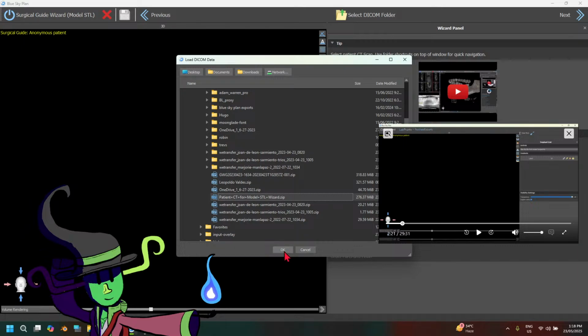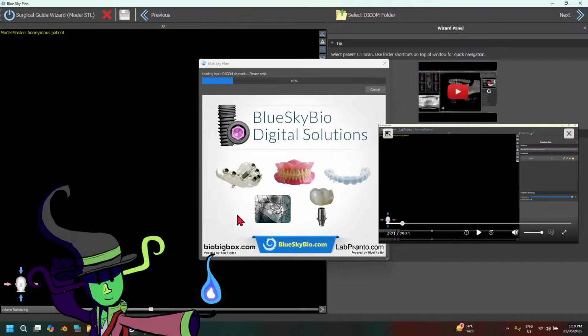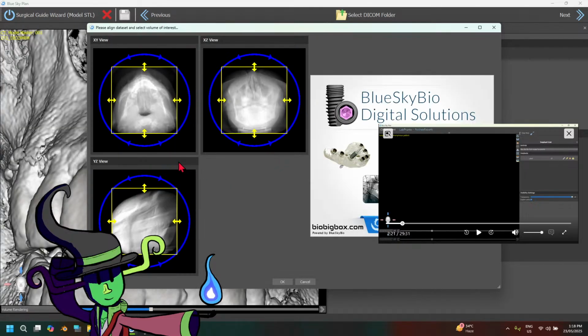So if I just click this, this should bring up my CBCT scan. Okay, the DICOM data. Okay, cool.